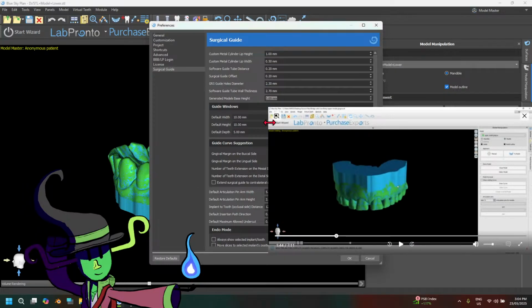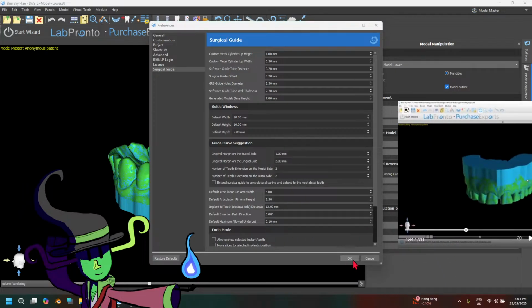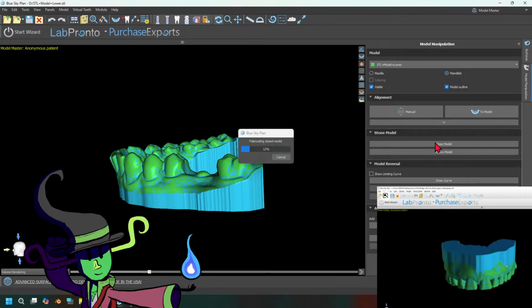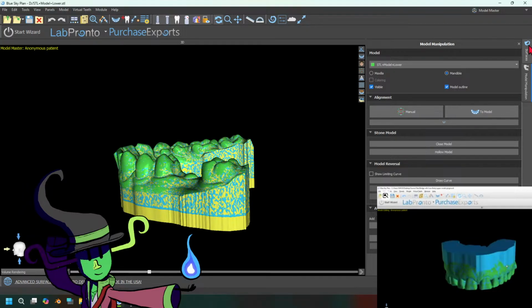Let's make it 7, maybe. That's okay. There we go.